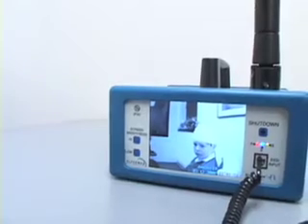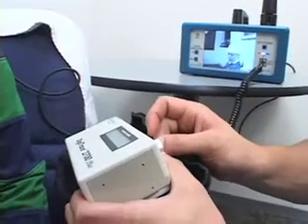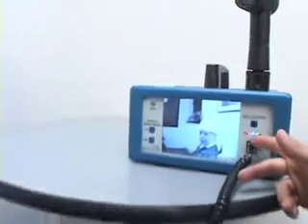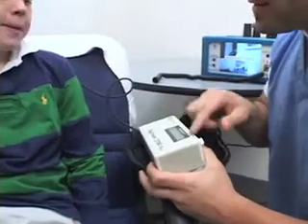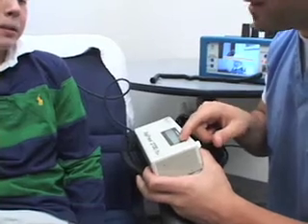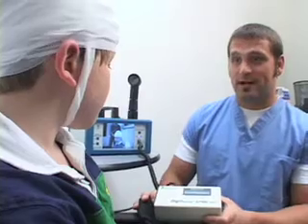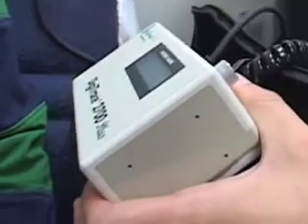In those cases, you will be provided with a DigiTrace video recorder that is easy to set up and use at home. Video images coupled with the electrical signals from the brain can be very valuable to your doctor when certain types of epilepsy syndromes are suspected. Following your setup, our technologist will provide you with instructions for your test and set up an appointment for you to be disconnected. The technologist will review key points to ensure you have a successful study.